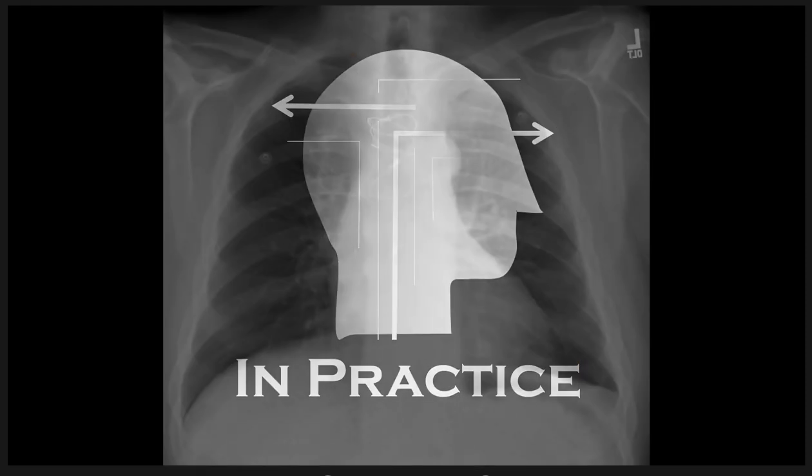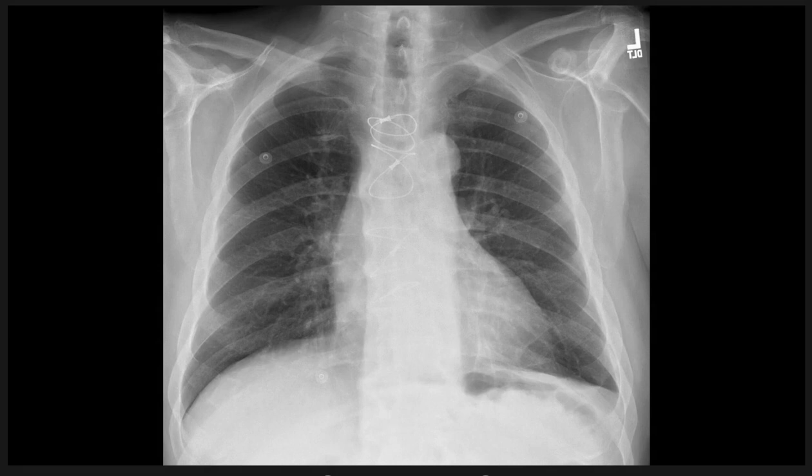Have a look at a practical case. This is probably the most common look and the most common reason to see this, at least in my experience. So right there, close look, we notice that it's blunted. And now, I'm going to point out this right here. So these are sternotomy wires. This patient has had a prior CABG, prior cabbage. You can imagine that if you're in there, sawing bones up and sewing on the heart, that you could get a little bit of fluid, blood, in that pleural cavity. So that's like a trauma, a little bit of blood there.